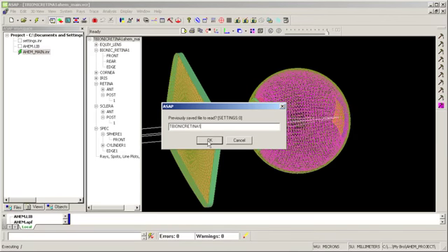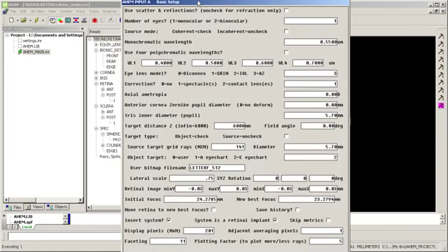I've got my Bionic Retina settings. Alright, so here's my first splash screen, and I've got a basic setup similar to the default model. However, when I get down to the bottom, I have an option to insert system, and a Bionic Retina is a system. But now it asks me, is a system a retinal implant? In this case it is, so I have that checked.